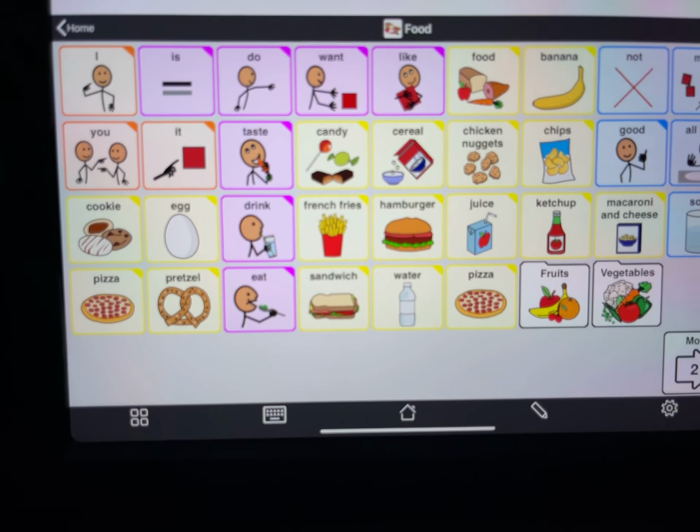So, okay, we have some foods, some people customized. You can customize one device with both kids in mind. There should be an About Me folder for each person at some point. You don't have to do it right away. That says like quick buttons. My name is blah, blah, blah. My phone number is this. This is where I live. You can set that up now and then just customize it on each one.